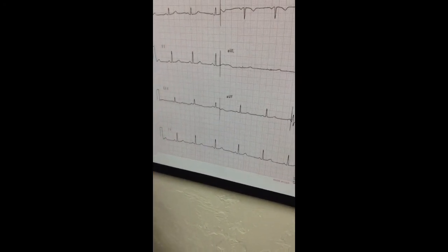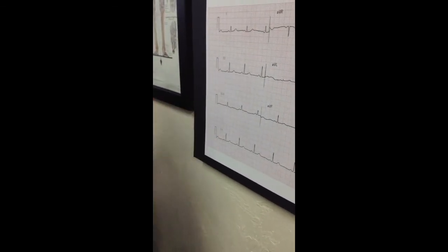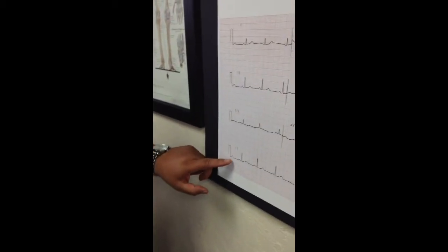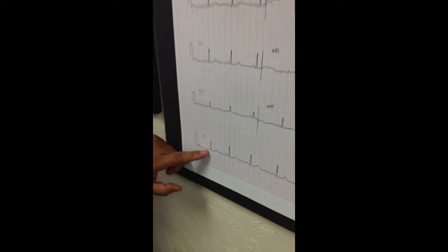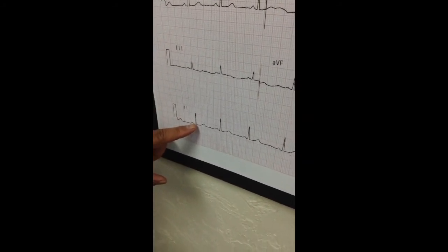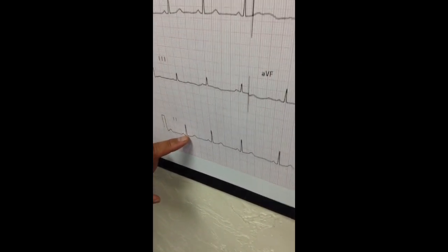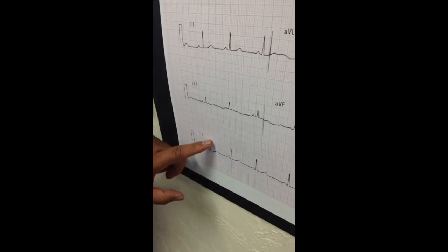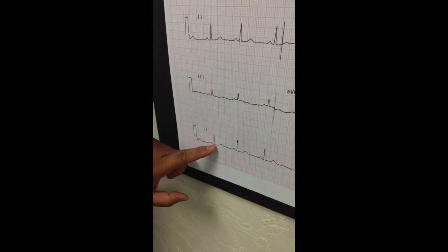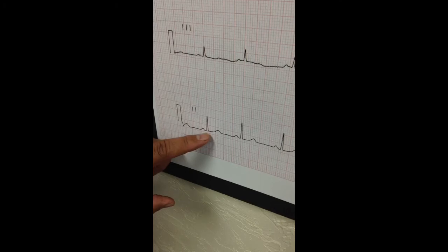What people tend to do is they get confused as they see this, maybe this T wave from a previous cardiac cycle, and they automatically think that it is the P wave. But remember, the P wave always comes right before the QRS complex. Now in this particular complex, you can see that the Q didn't go down. That's okay, but it's right there at that corner where the Q wave represents. The R goes up, and the S didn't come down like I showed you on the board, but it came down just a small amount. That corner still represents your S.